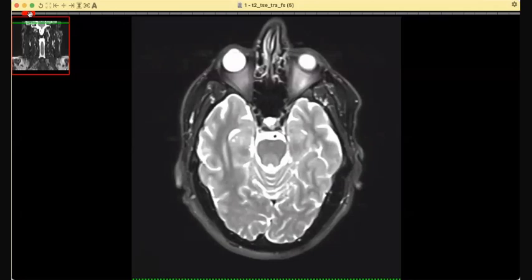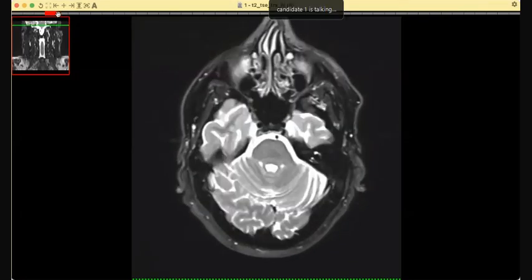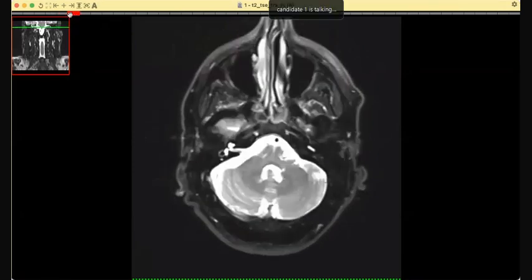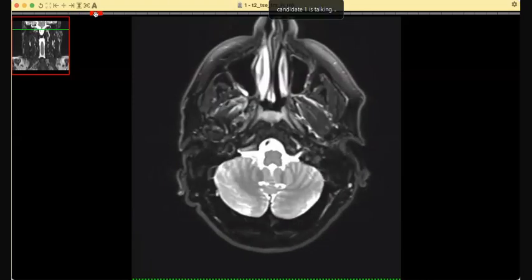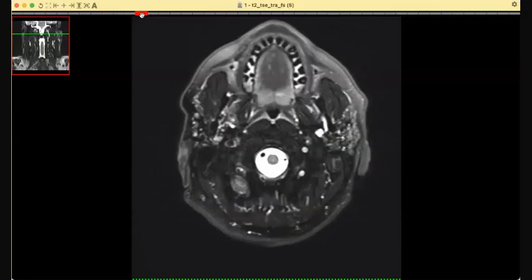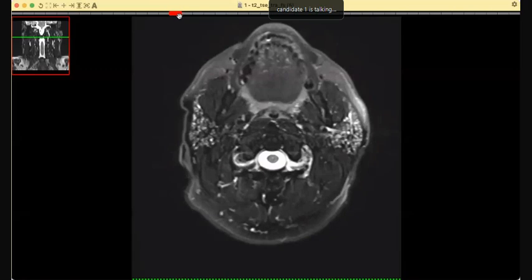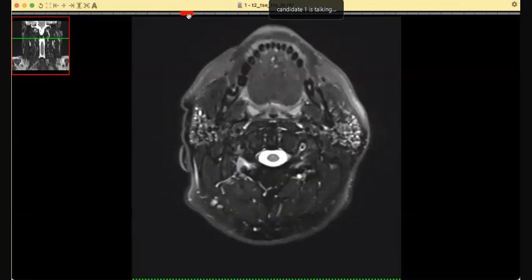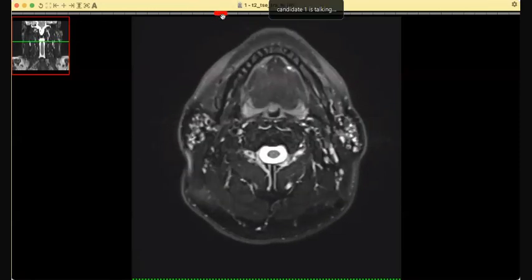The partially visualized brain parenchyma appears to return normal signals with no significant intracranial mass. The maxillary sinuses look clear. I'm just going to review the symptomatic region of the neck now. I cannot see any abnormality in the submandibular region or floor of mouth. I'm just going to carefully assess the neck region.